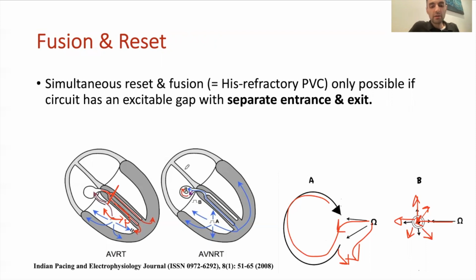Okay, so in this example, you have a septal accessory pathway. You deliver a pacing stimulus at the time when the His is refractory. Like we said, you will demonstrate fusion and you will leapfrog into the accessory pathway, and your atrial timing would differ, usually accelerated, because you shortcut the circuit. Instead of the circuit going all the way down and then all the way up, you pace here, so the circuit goes down, and then you pace from here, and then the circuit goes up, and then it goes down, and you pace from here, the circuit goes up. So as if you shortcut the circuit.